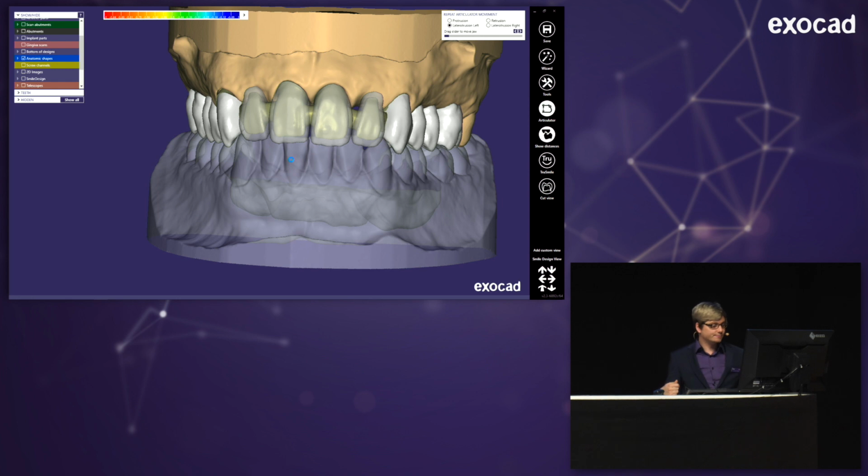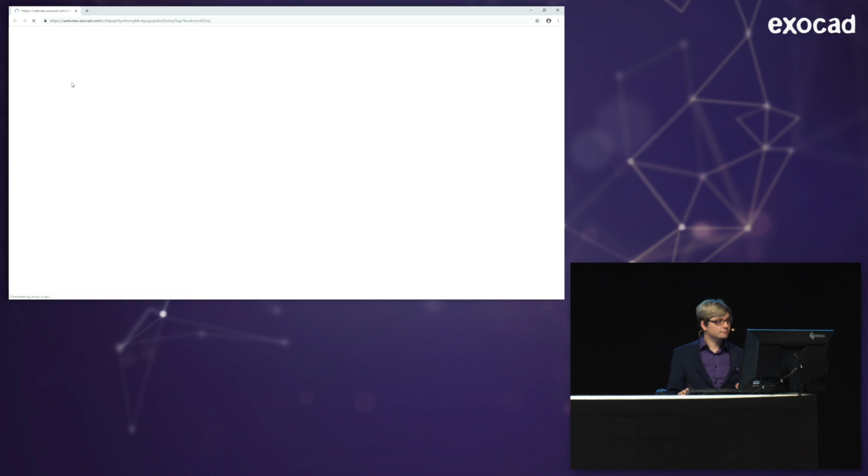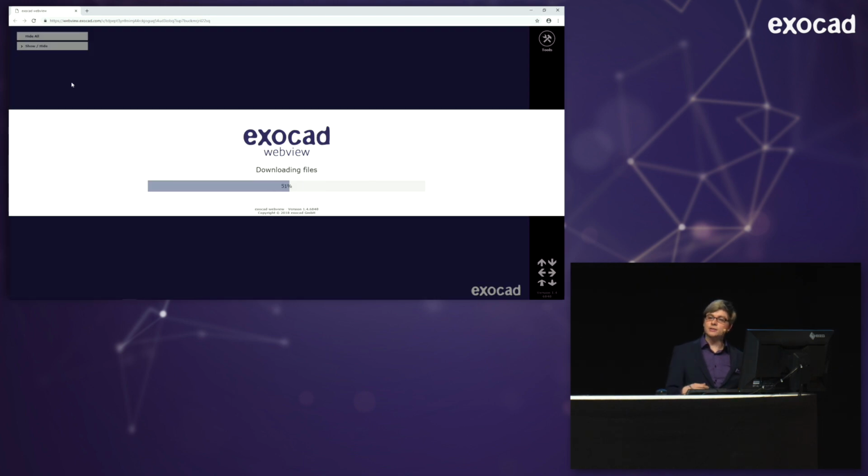And if I'm uploading this, it gives me a link. And I hope you don't think of me rude because I'm taking out my cell phone for this. And I click on the link, and I just open it in my normal web browser, like every browser this works with. And it also works on your smartphone. That's why I took this out. I think you've already seen this yesterday. I'm sorry. You've seen this yesterday in the demonstration from Larry.